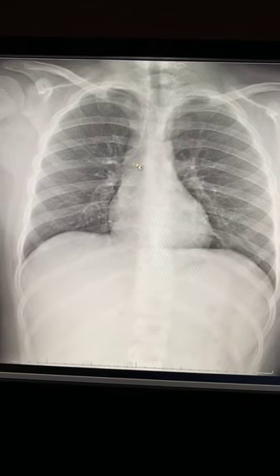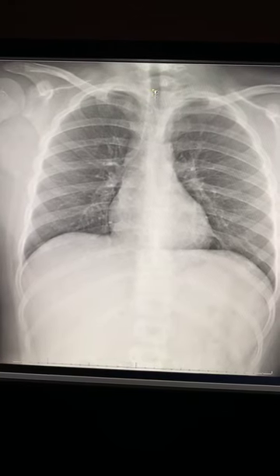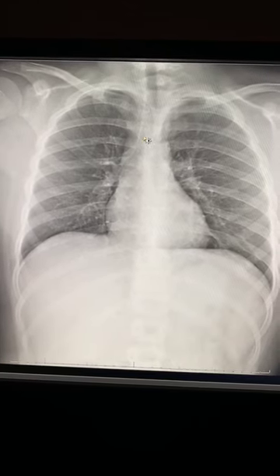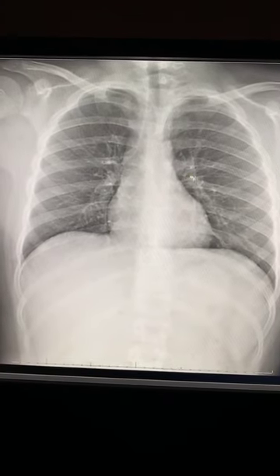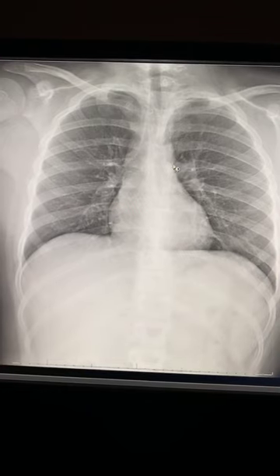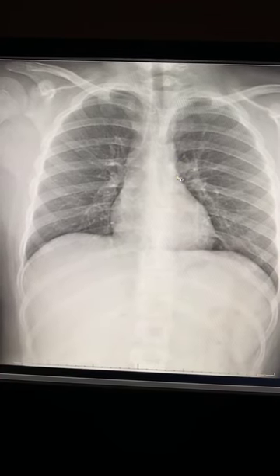This is the mainstem bronchus. This is the carina right here. The left mainstem bronchus. I come up. Nice trachea, everything looks good. I look at the hilar contours while I was around this level. This hilar contour looks pretty good. See this indentation? It's concave like that, right?